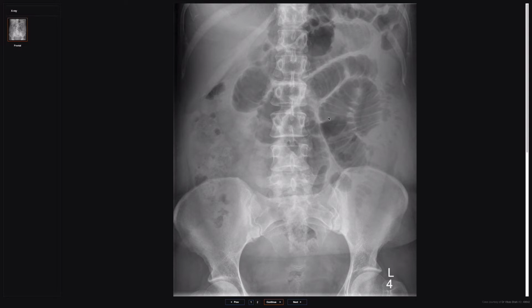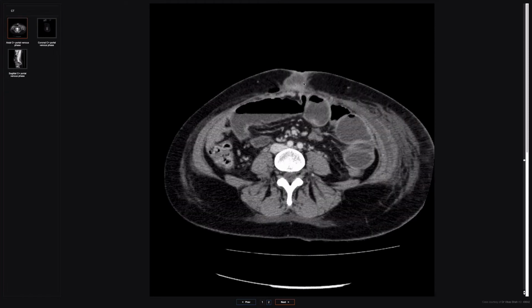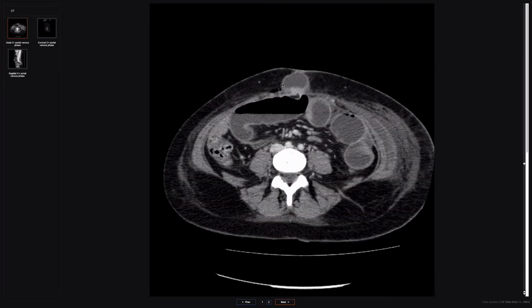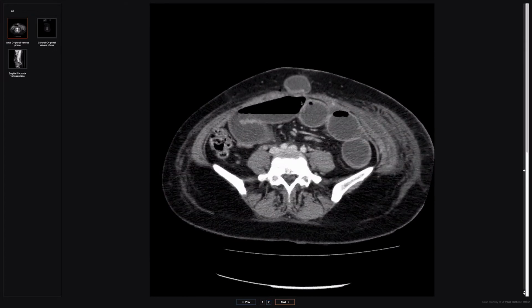But on our supine radiographs, which is how we take them, it's difficult to see the bowel loops which are filled with fluid because there's nothing to appreciate. It's difficult to appreciate them versus the background soft tissues. Whereas when they're distended with air, like you see here, then you can appreciate that. That particular case was because of obstruction at a midline hernia. This is actually someone who had recent laparoscopic surgery, and this is one of the port sites, and a little bit of bowel has been caught in there. And so it's causing obstruction of all the small bowel upstream from it.